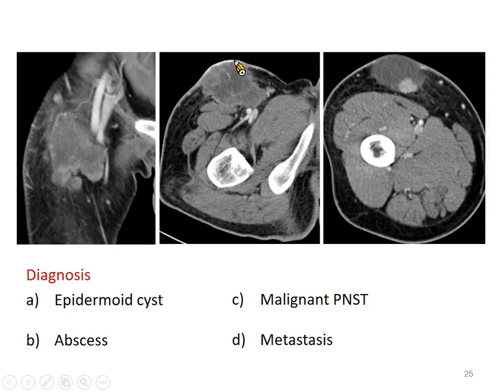Okay, so a big tumor with ulceration, go for sarcoma. Okay, in this case of two tumor in two different sites, so it should be metastasis, melanoma. Melanoma is hard to say because it is a CT scan, but it is metastasis.